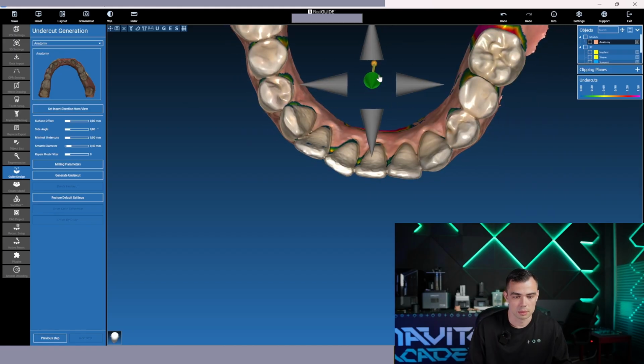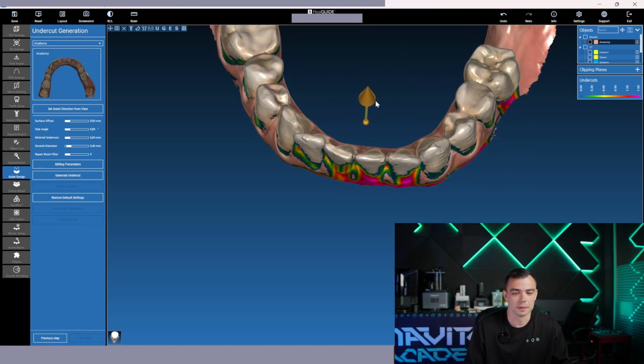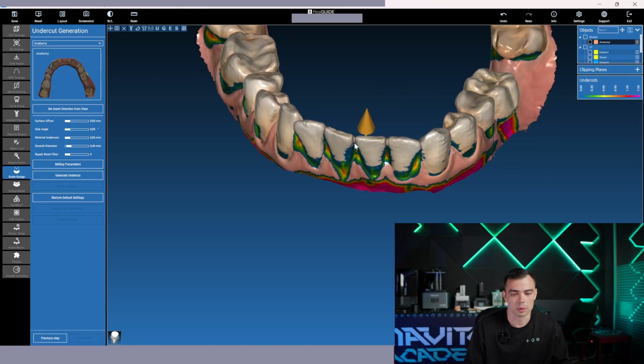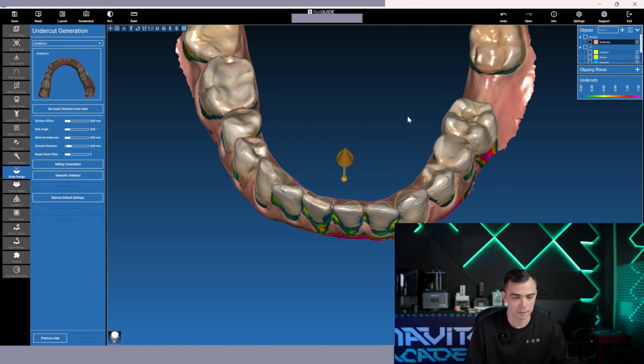because it's quite simple. We just think about physics and realize that the more contact there is, the more stability and the more retention we'll get in the end. So that's what we need.